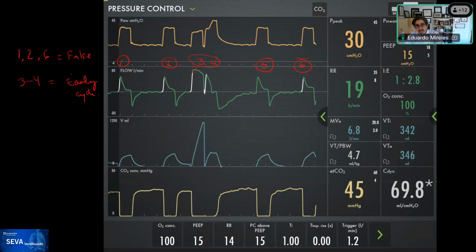And actually, if you imagine the curve for exhalation goes all the way over here, and then it resets, and then there gets another breath, which is mandatory. So very, very nice, right? So yes, you're right. This pressure waveform is also below the other one, which may signify that the ventilator could not pressurize to the level that it should because of the breath.